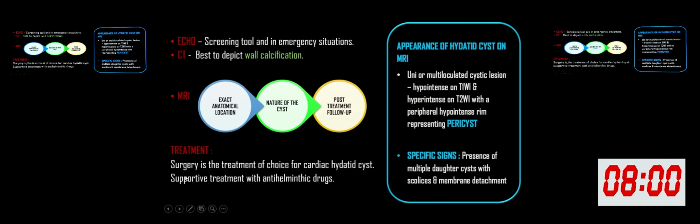So MR is very useful to predict the exact anatomical location and the nature of the cyst, and for post-treatment follow-up, as in our case. And I wanted to show this case to show the imaging findings in the late gadolinium enhancement and the parametric mapping, which have not been reported before. Thank you all.